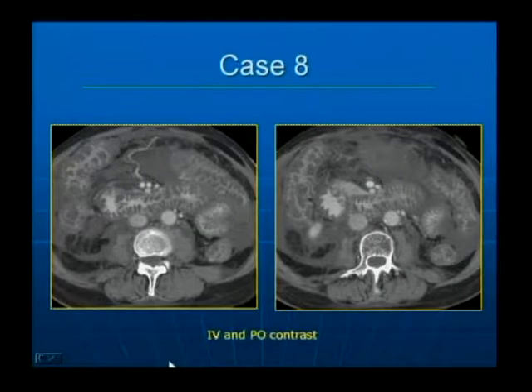So a couple of images from the CT show profound, obvious abnormalities. I think you can all see that there's ascites, and the small bowel is abnormal. So is the small bowel focally abnormal or diffusely abnormal? Diffusely abnormal. So which pattern would you put it in? Is this thick folds, nodular folds? Mixed? So these are thick folds, right?